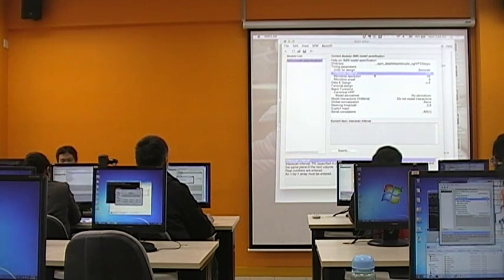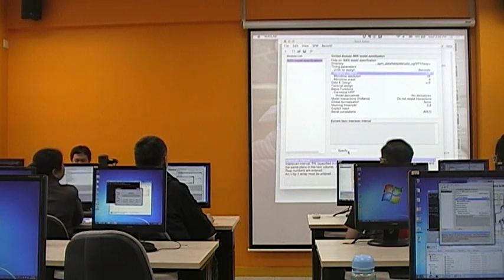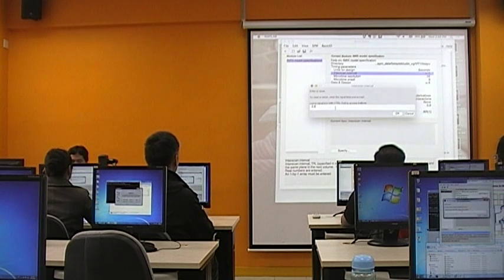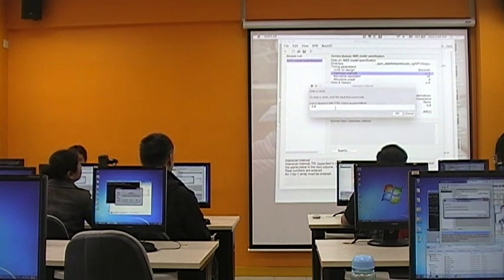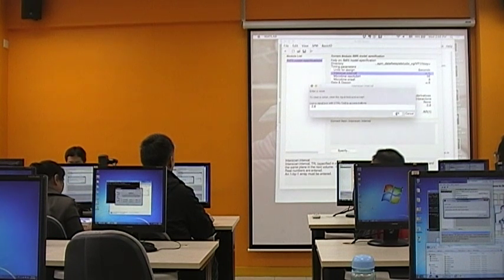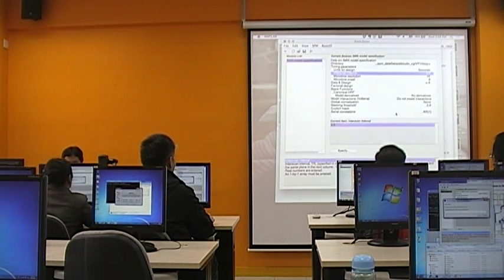Okay? If you remember the preprocessing step, during slice time correction, we put in this value once. Here again, you need to find out from your MR technician if you have your own data. This time we are using a TR of 2.6 seconds.